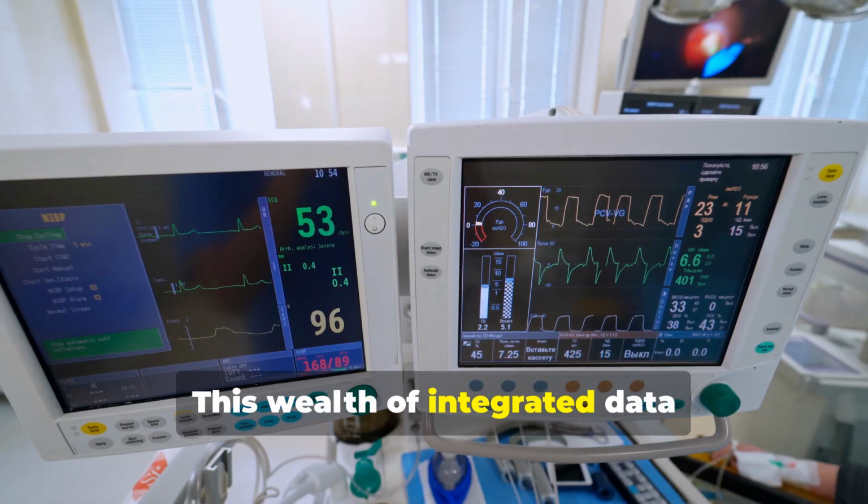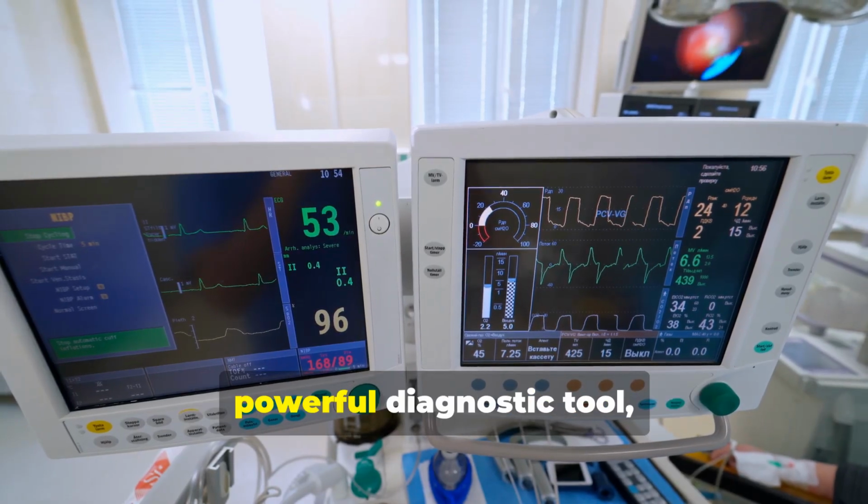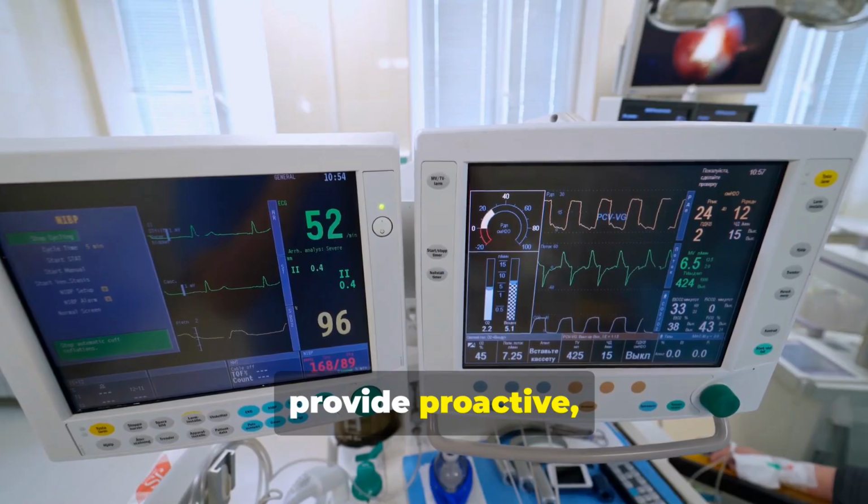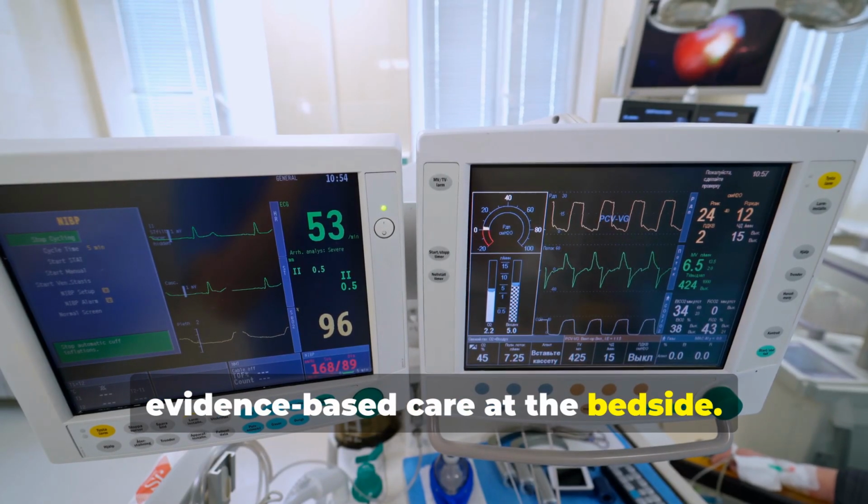This wealth of integrated data transforms the ventilator into a powerful diagnostic tool, empowering the entire clinical team to provide proactive, evidence-based care at the bedside.